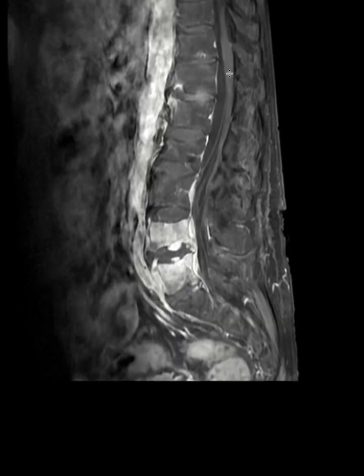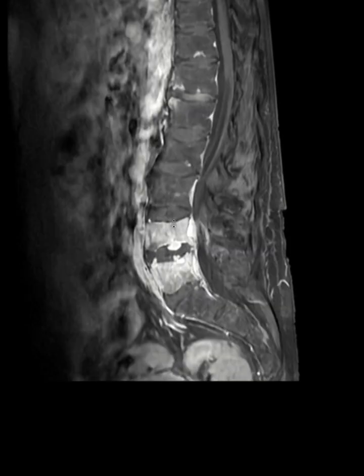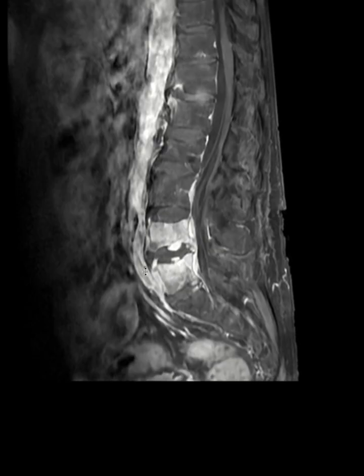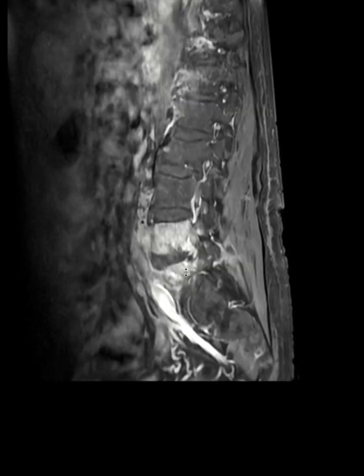There is no abnormal enhancement in the cord or leptomeningeal through the caudal nerve roots, but you know that there is avidly enhancing areas in the L4 and L5 vertebral bodies extending to the disc space. We have a lot of perivertebral soft tissue edema enhancement, phlegmon formation, and then we have this epidural enhancement, as you see in the posterior aspects of the L4 and L5. And if you look closely, this is also involving the neural foramen.